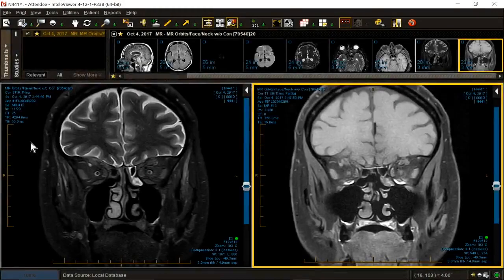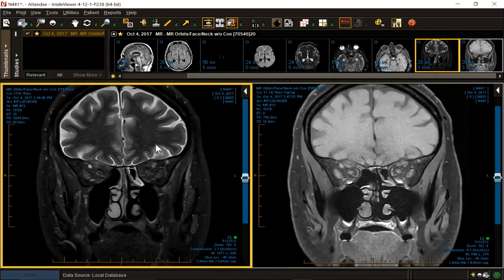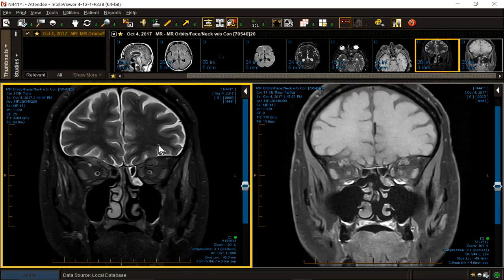In children, meningiomas have a different connotation. You've got to search much harder for NF2. It's only 2% of childhood malignancies, of childhood neoplasms. The age on this patient is 32, so pretty young. We didn't get a chance to talk about mimics of meningioma and other histologies. So while I've been pontificating, I hope you have found the meningioma.